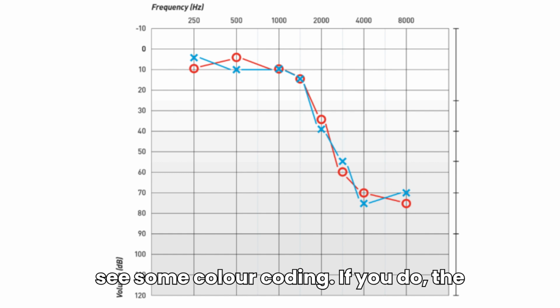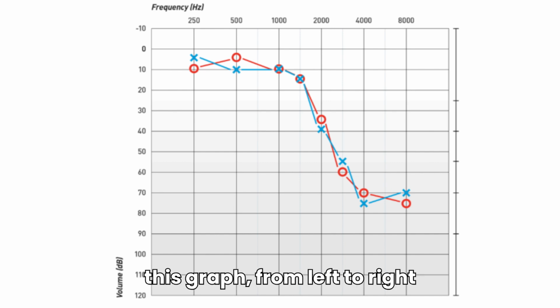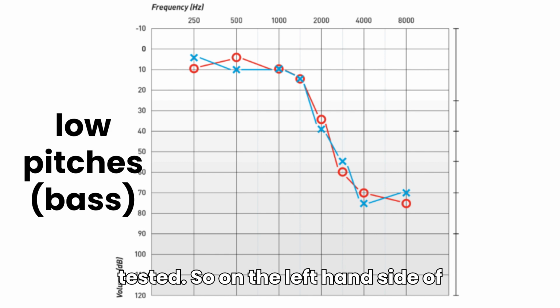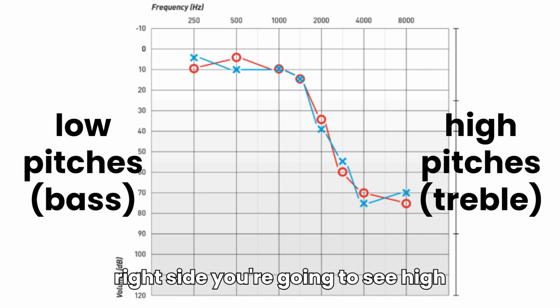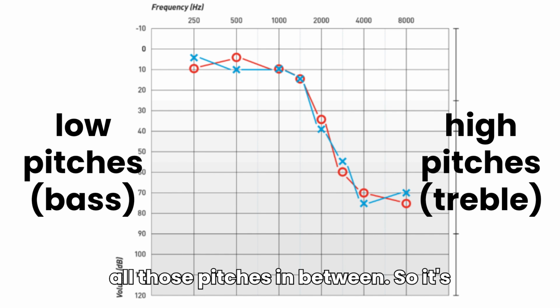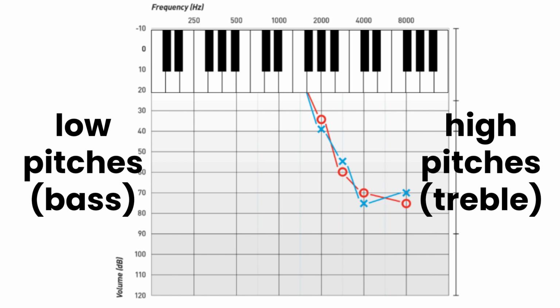You might also see some color coding. If you do, the red is for your right ear, the blue is for your left ear. Now, when we look at this graph, from left to right shows the different pitches that were tested. So on the left-hand side of the graph, you're going to see low pitches, like bass. On the right side, you're going to see high pitches, like treble. And then all those pitches in between. So it's like a piano, from low over to high, or bass to treble.